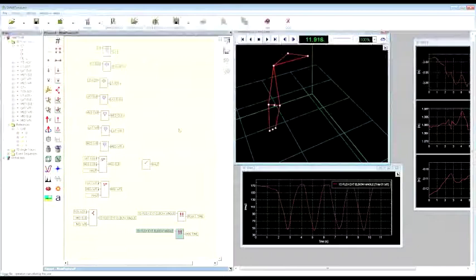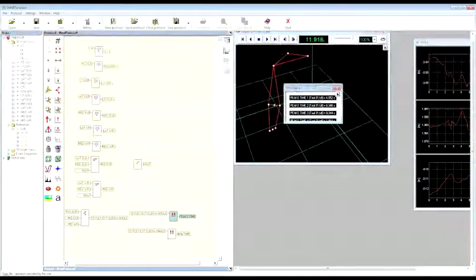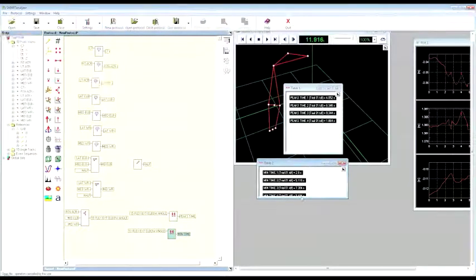Let me just show you the results. The peaks time is the time sequence of events where we have the maximum value of the angle, while the second sequence is the sequence of time in which we have the minimum value of the angle.